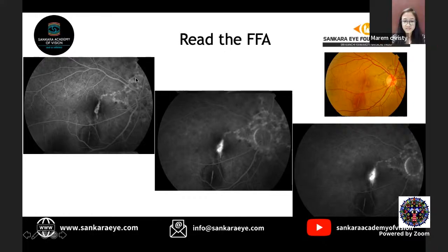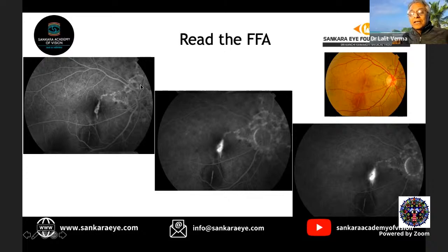So I appreciate the way Ajit Babu said in the beginning, don't become a super consultant: start with the disc, surrounding area, vessels, macula, general retina. You will not miss, because around the disc there are these pigmented kind of tracts, and one of the tracts is running across the macula, and there is a subretinal heme here. That is good enough. You see these tracts and subretinal heme point towards some kind of angioid streaks, which we'll discuss, say, Paget's disease or so many other diseases.